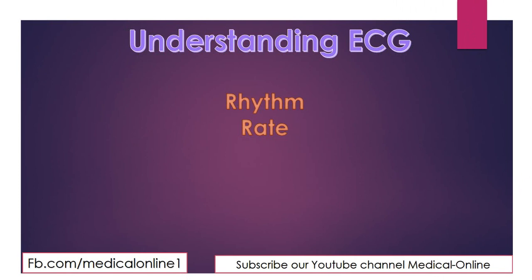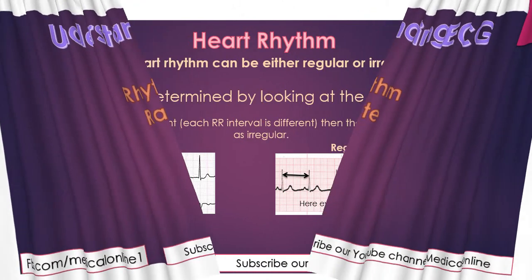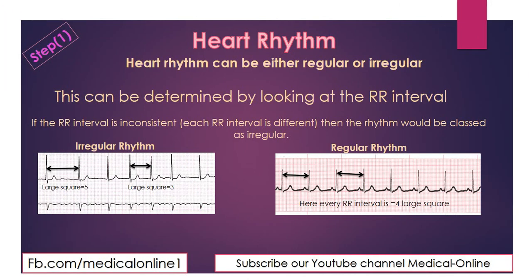First of all, whenever you are looking at the ECG strip, the first step is to class it as either regular or irregular. Then you will go further. How will you class it? Either it is regular or irregular. This can be determined by looking at the RR interval. Remember, rhythm is determined by looking at the RR interval.